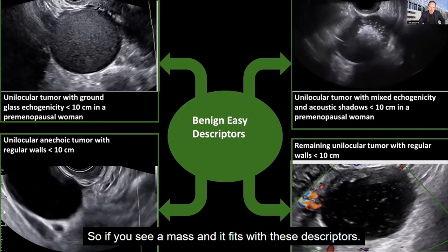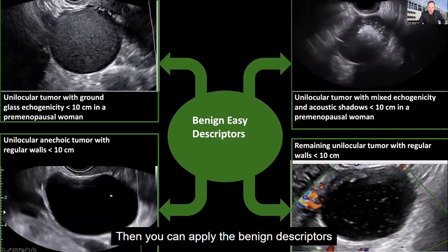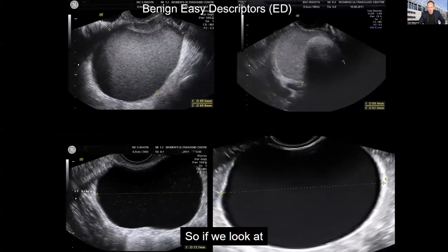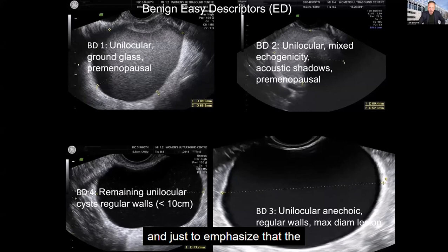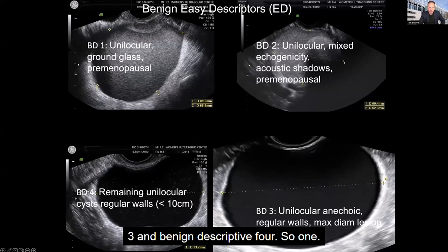So if you see a mass and it fits with these descriptors, then you can apply the benign descriptors as long as no other features are present. So if we look at them again, just to run through them with some different examples, and just to emphasize that the mass has to be less than 10 centimeters for benign descriptor 3 and benign descriptor 4. So benign descriptor 1, mainly endometriomas, 2, mainly dermoids, and then these 2 unilocular cysts, anechoic or not.